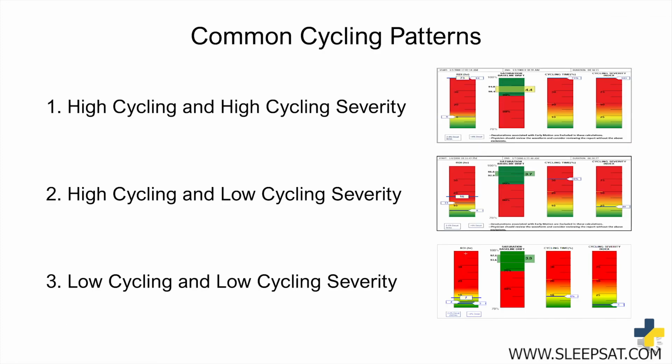Now that we have an understanding of cycling time and cycling severity, we will go into three pattern studies: high cycling time and high cycling severity, high cycling time and low cycling severity, and lastly, low cycling time and low cycling severity.